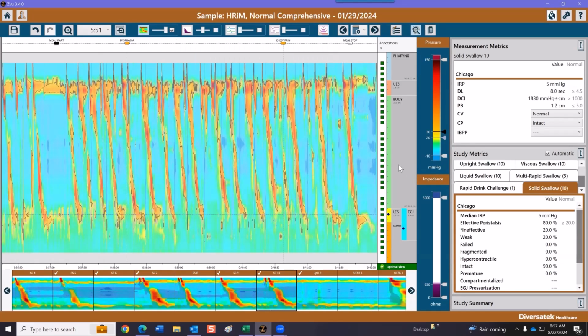With a solid meal, it was nearly impossible to make measurements during the uncontrolled consumption of the meal. So in this case, the meal start was marked, the meal end was marked, and any reported symptoms were annotated. Underneath the meal start annotation, there is also a solid meal annotation. With this annotation, any measurement made to the right will be labeled as a solid meal measurement.